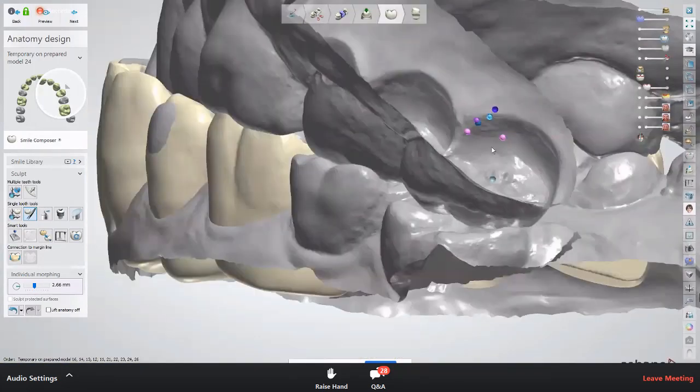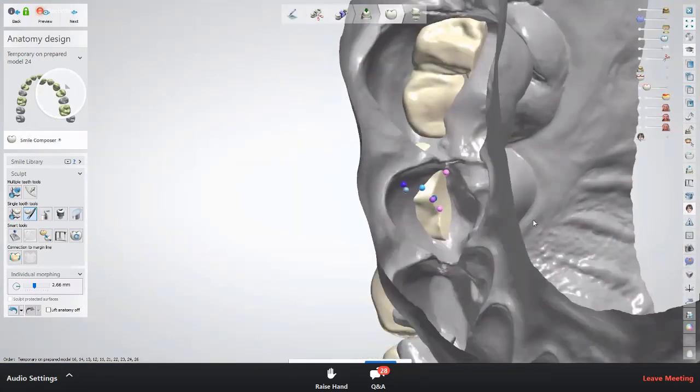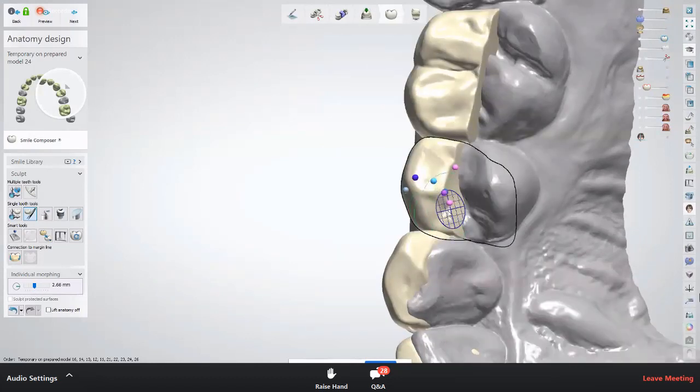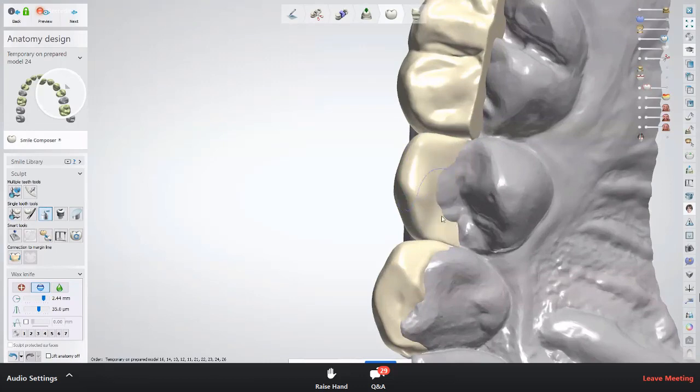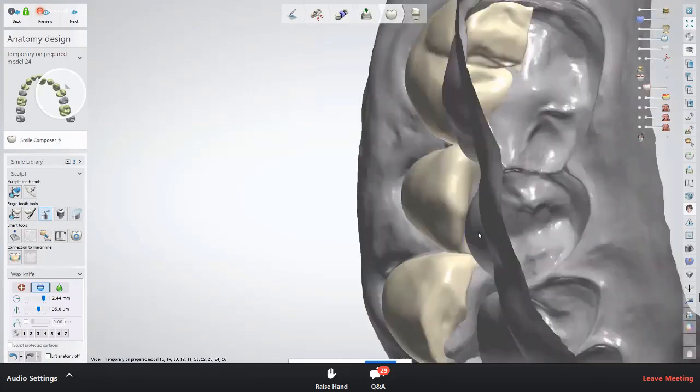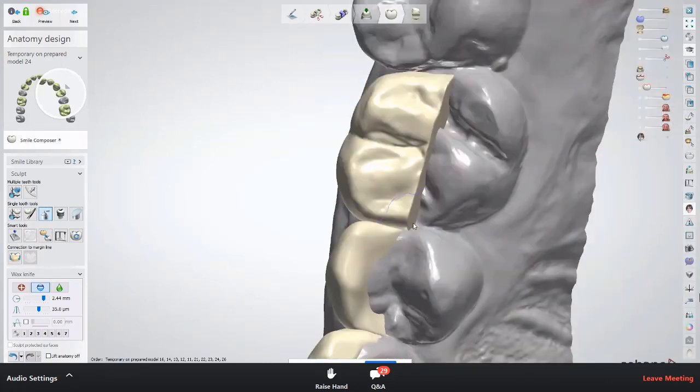This is a really strange case. I never did this case before, I didn't train on this. We didn't make a demo on this case either before. So this is really a live case. This is what I would do any day on this patient as well.